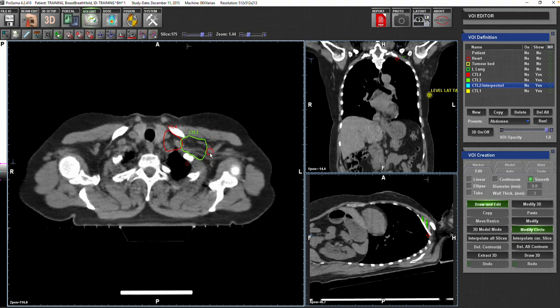It's very difficult. So what we're going to do now is draw the space between the pectoralis major and minor muscle, edge to edge of the muscle, so you don't go beyond the lateral edge and you don't go to level 3. And then you need now to draw level 2, which you go to the posterior edge of the muscle. Okay, so I'm covering the muscle now, but posterior to the muscle there are the vessels which I'm concerned about. So you need to cover the vessels as well.